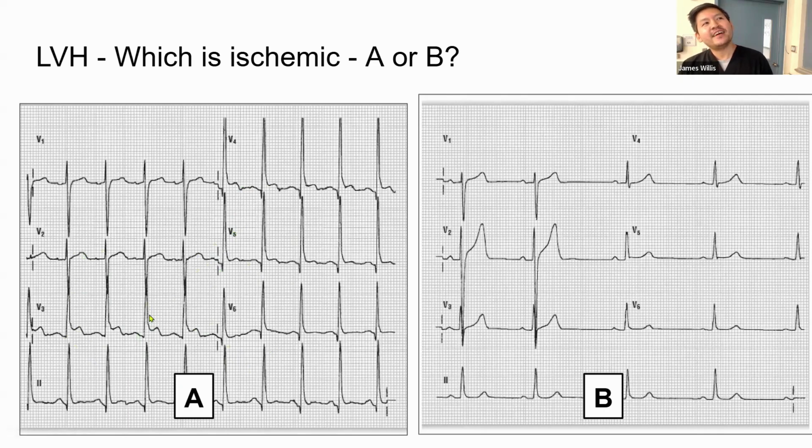It's a good thought, but in the QRS distortion you actually see kind of the S wave. Here it's completely obliterated, and this is just like the STEMI. What about B? Yeah, I think this is probably LVH, but not enough to get me to trigger a STEMI alert.